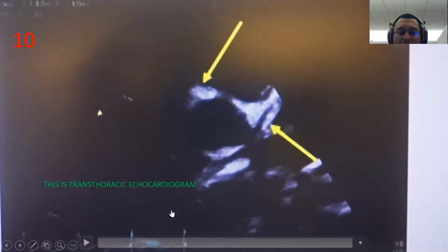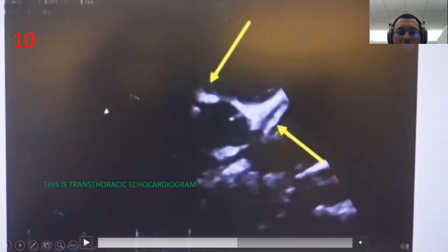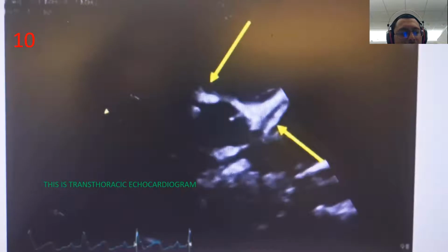What am I showing here? I have just one question. With a systemic RV, when technically we want to measure PAP, the estimated pulmonary pressure, you will also measure in the RV, but it is actually LV pressure, right? I mean, it's just reversed.